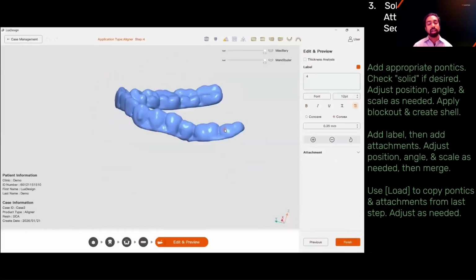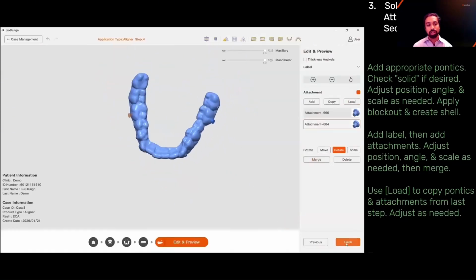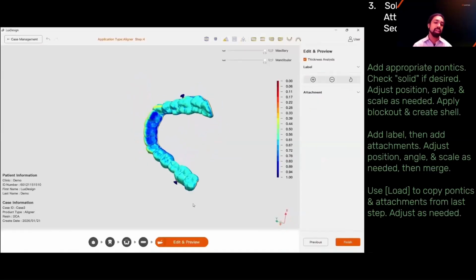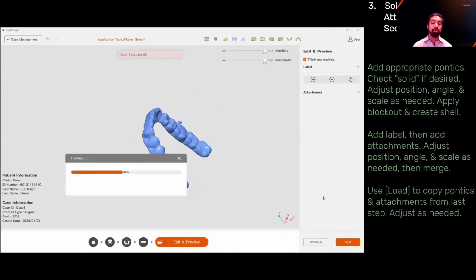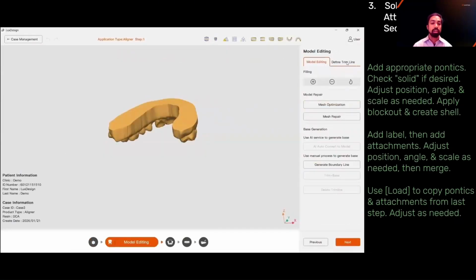And I think fast track is a little bit faster, but when you're doing solid Pontics and you're doing your custom attachments, this is really, really fast for something that is so powerful, so unique, and something that you really can't do with any other methodology. It's really hard. You can't thermoform this. You can't really design this any other way.